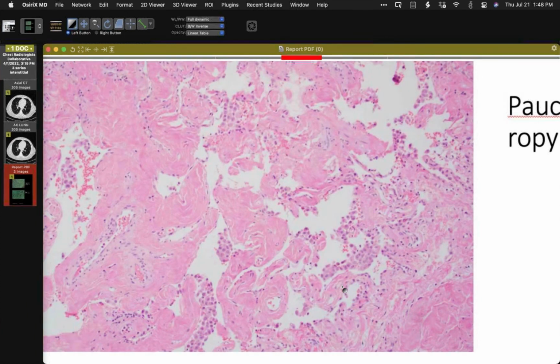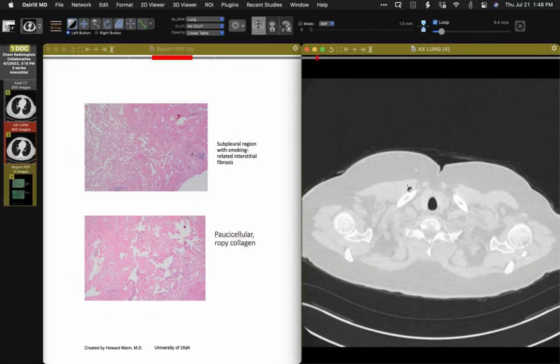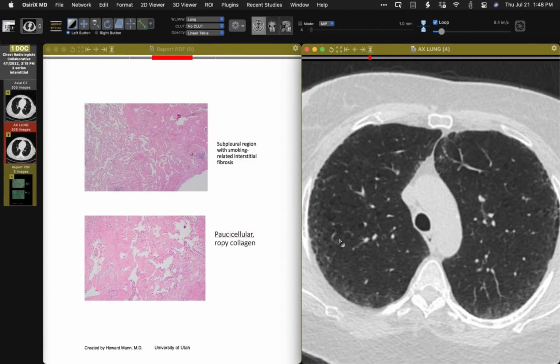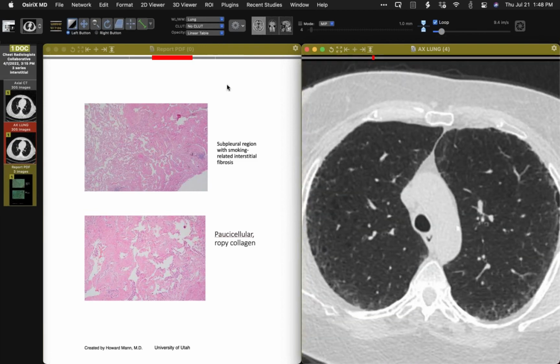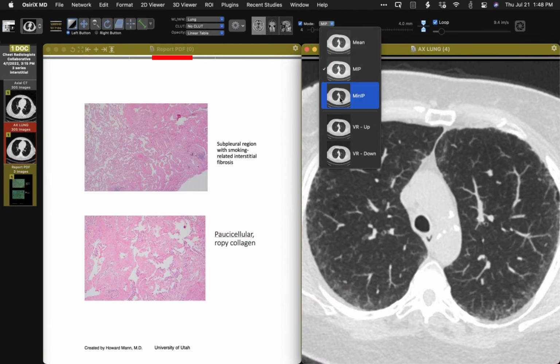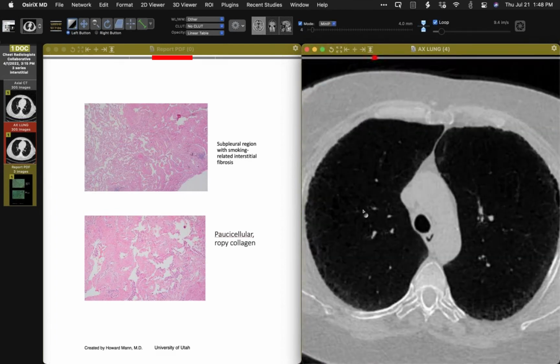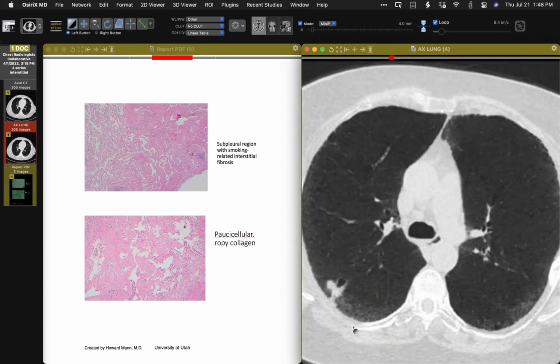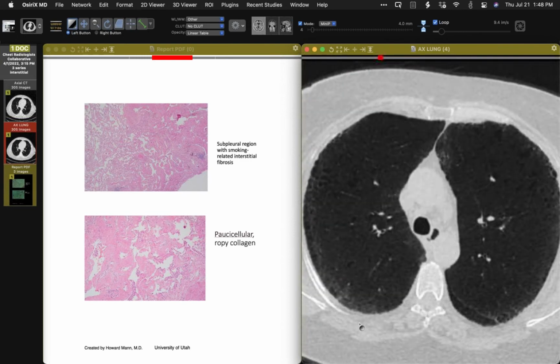It's gorgeous. I think the other thing that's really helpful in recognizing smoking-related lung fibrosis is its frequent combination with paraseptal emphysema. So you'll often see them occurring together. It's so true. They are so conspicuous with the paraseptal emphysema, and I still don't understand paraseptal emphysema personally. It's an odd thing to me, just understanding the mechanism of it. But yeah, it is so pronounced with the paraseptal emphysema.